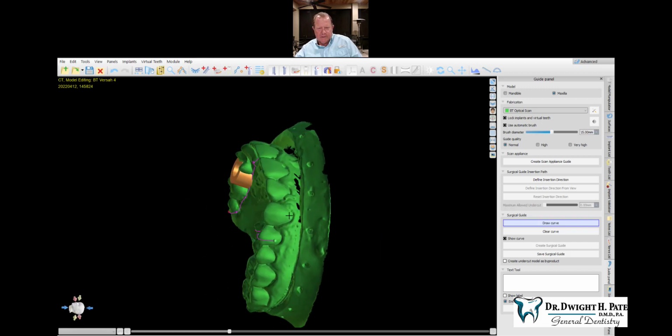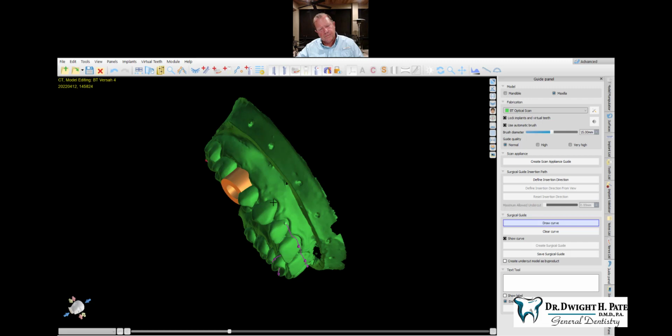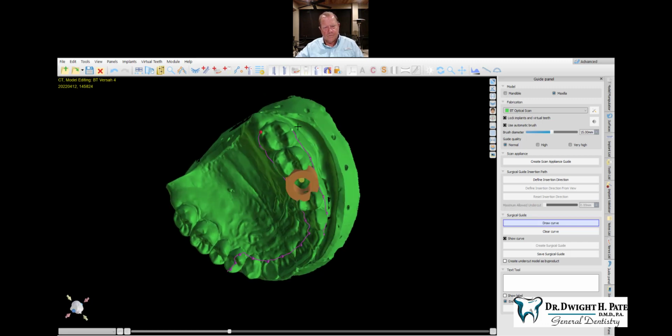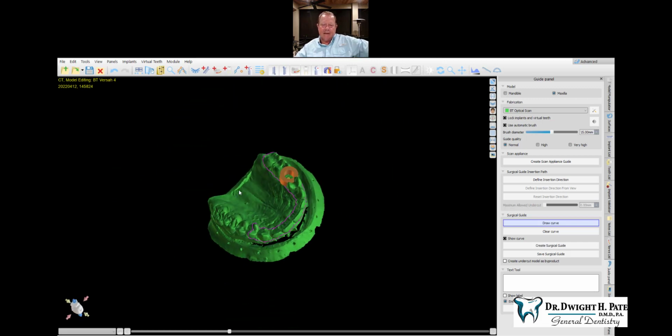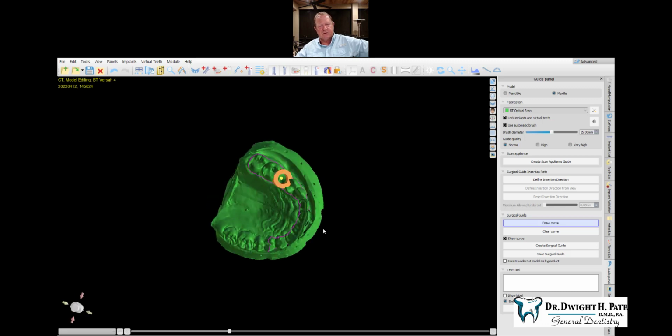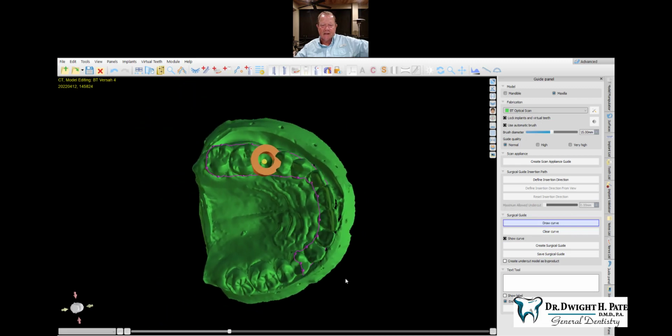We draw the curve by holding your shift key and clicking these points, and coming on around. And I can add some inspection windows. There's lots of other things I can do to this, but essentially, I'll add one real quick right here.